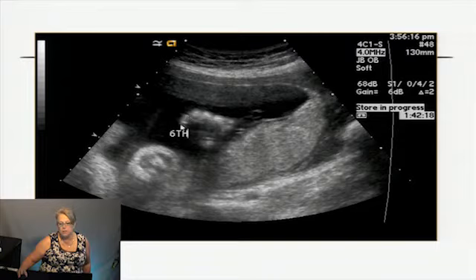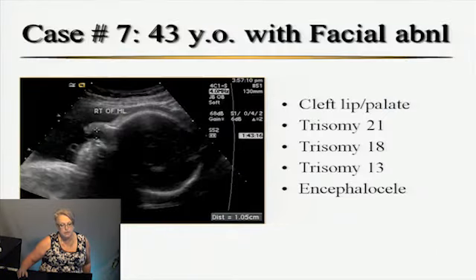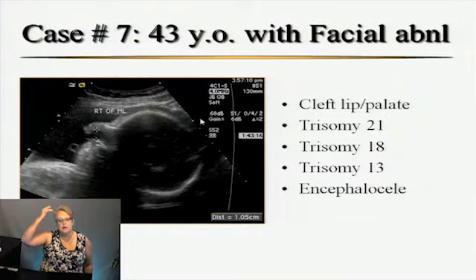So which kind of polydactyly do we have? Postaxial, it's on the pinky side. So postaxial polydactyly, that is the most common type. So if we look at the hands, then look at the other hand, and then we look at the feet. But this is that defect here in the upper jaw. So, it's a combination of everything.